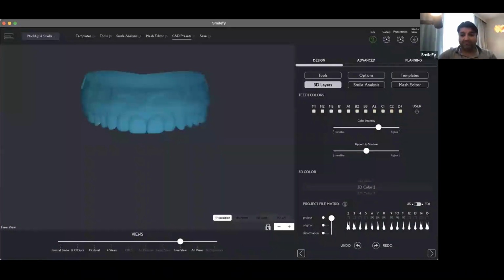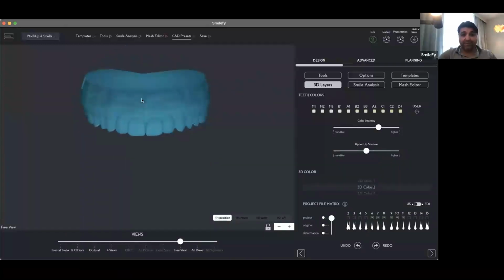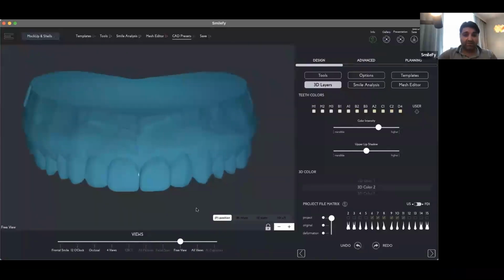That's the mockup. One file, you see, now it's no more design, it's just one file. That's the mockup. Closed mesh, ready to print, and that's our result that we print.